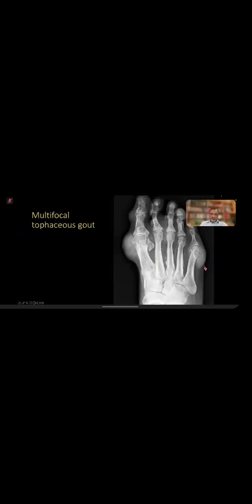So in the foot, what is the commonest place? We all know that: big toe. Okay, and the other thing I mentioned there, TMT joints. So don't forget about TMT joints. We all know about the first MTP joint or big toe joints, but gout also involves the TMT joints. And the rule is the same: if you see big erosion of the TMT joints, think of gout. Look at that, this is very typical. You can see that big erosion, extra-articular erosion, dense asymmetrical soft tissue mass. Okay, and the big erosion can, in fact, be here, big soft tissue mass, tophaceous gout, and the same thing is here.